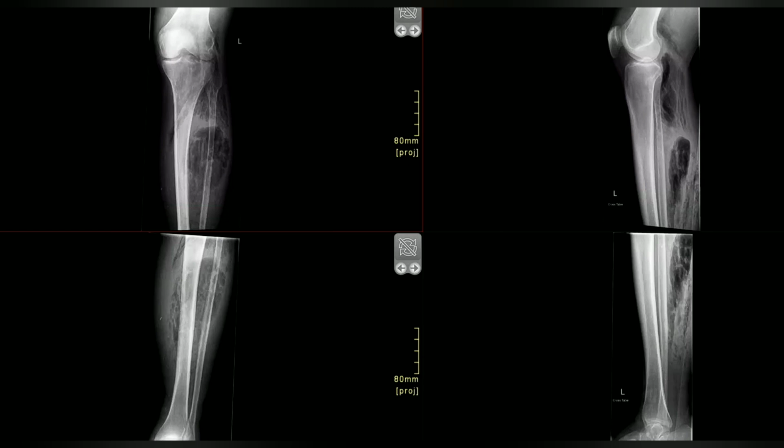These are the X-ray knee joints, including the tibia, frontal projection of a skeletally mature patient, where I can well appreciate that there are multiple ill-defined lucencies involving the fibula and with extensive soft tissue swelling associated with it. And multiple air lucencies are also noted in the surrounding soft tissues.